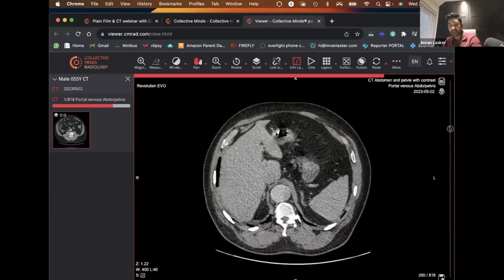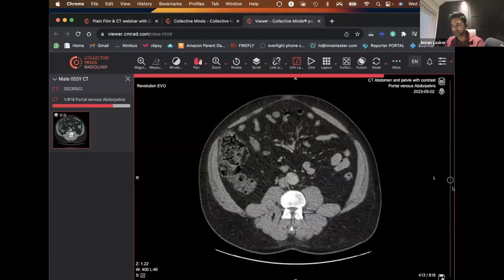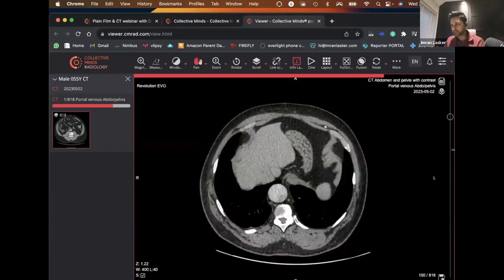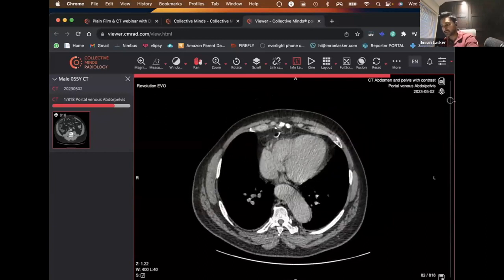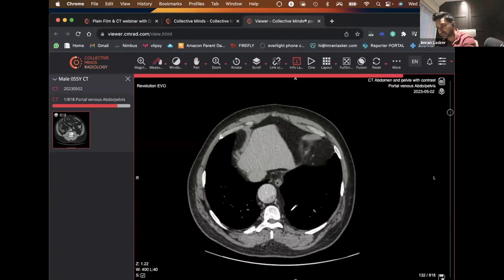One of the challenges I've always found with what we're looking at here, someone's already pointed out, I'm just going to go for it because the rest of it is not quite uploading just yet. As you come to the top of the image, some people may not spot straight away that this aorta does not look normal at all, right? If you keep your eyes down there, scroll down, you can actually see there's a linear density, a linear difference between this area and this area over here.